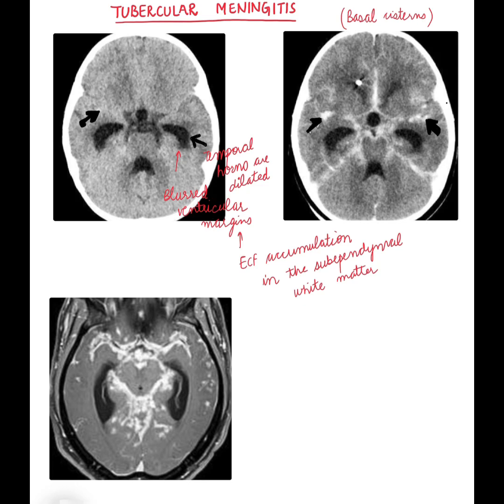As in the CT head, you can't appreciate the Sylvian fissures. So what is the location of the Sylvian fissure? Here. You can't appreciate the Sylvian fissure because there is effacement of the Sylvian fissure, because exudates have deposited in this region.